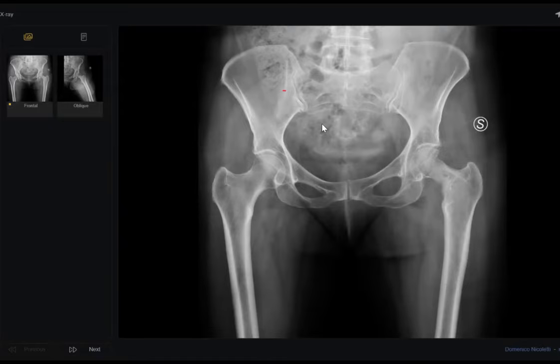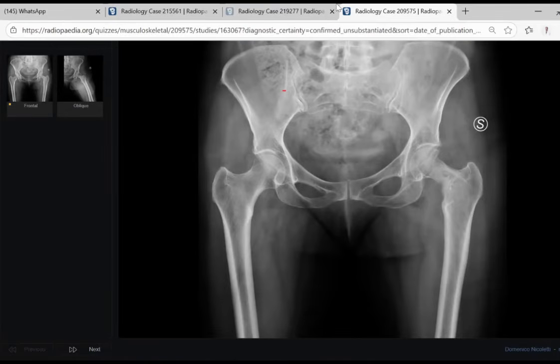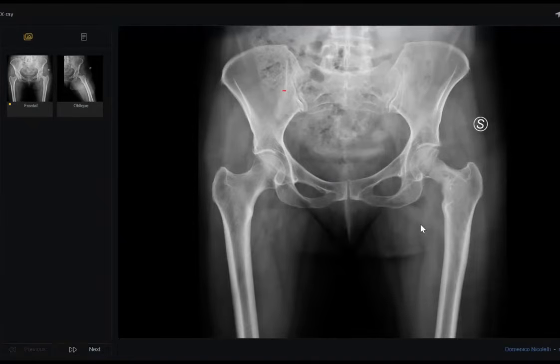There is no evidence of periosteal reaction. Hello? I'm sorry, my connection became unstable. No problem.